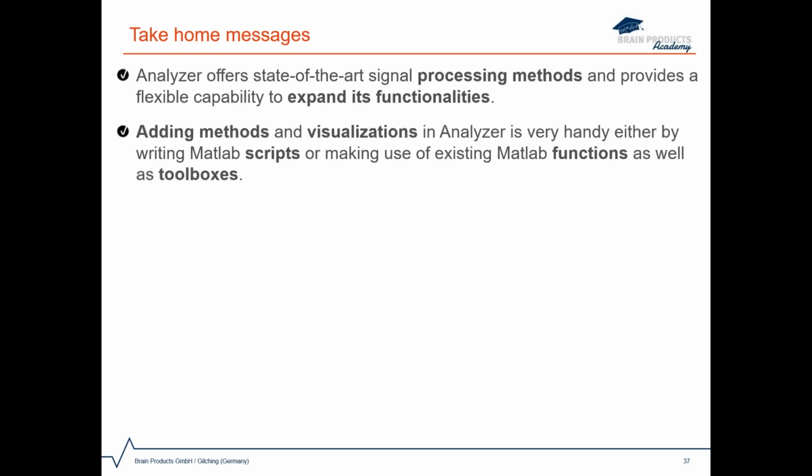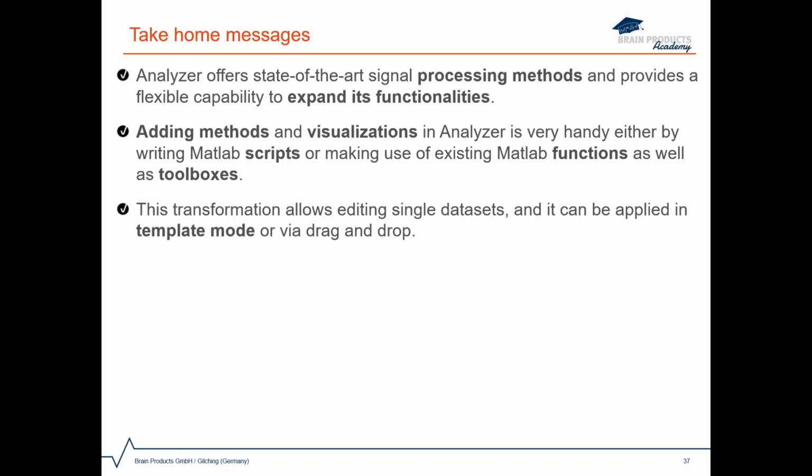We have shown in the demonstrations it is very handy to add methods and visualizations in Analyzer, either by writing Matlab scripts or making use of existing Matlab functions as well as toolboxes. This transformation allows editing single data sets, and it can be applied in template mode or via drag and drop.